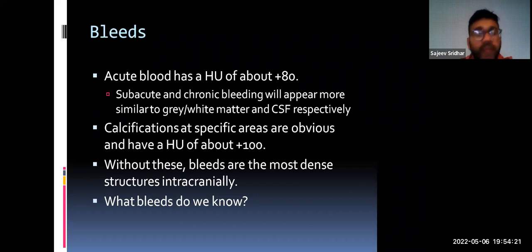And because choroid plexuses are in pretty much every ventricle, you can find calcifications there that you should not misinterpret as any kind of bleeding. There is a feature on many PACS software where you can calculate the Hounsfield unit on the area where you have your cursor. That will also allow us to gauge whether we are dealing with acute clotting blood or just calcifications.